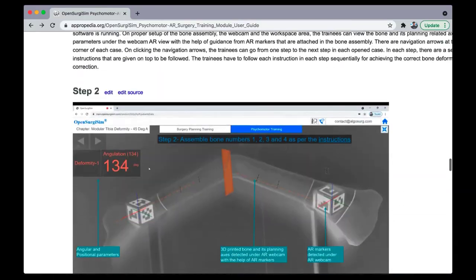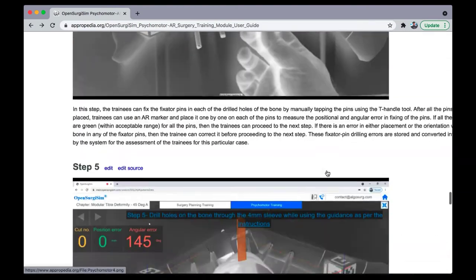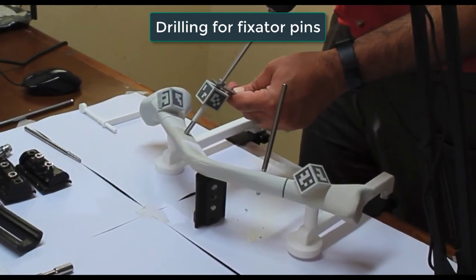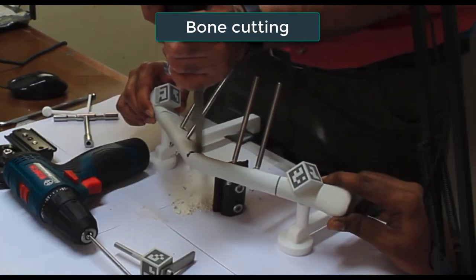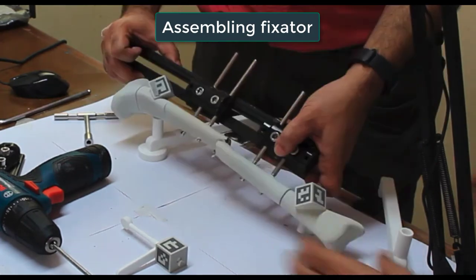The trainee then follows the instructions given by the software to perform various steps of the surgery, like assessing the extent of deformity, drilling and placing the fixator pins onto the bone in a pre-planned location and angle, cutting the bone, and finally achieving the correction by assembling the fixator frame to the pins.